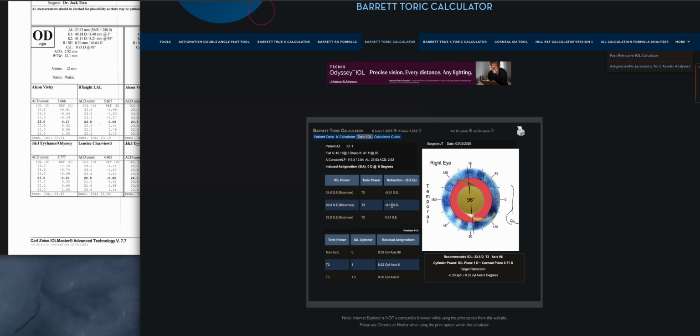Now what we're looking at here is, first we're going to pick a lens power. It's saying here that when the power is 23.5, the spherical equivalent is basically what, if everything goes perfectly and healing's as predicted, the patient will have: a minus 0.13 refractive outcome. Remember, these lenses come at half diopter power, so you can see they jump quite a lot. About 0.4 here and then 0.4 here.